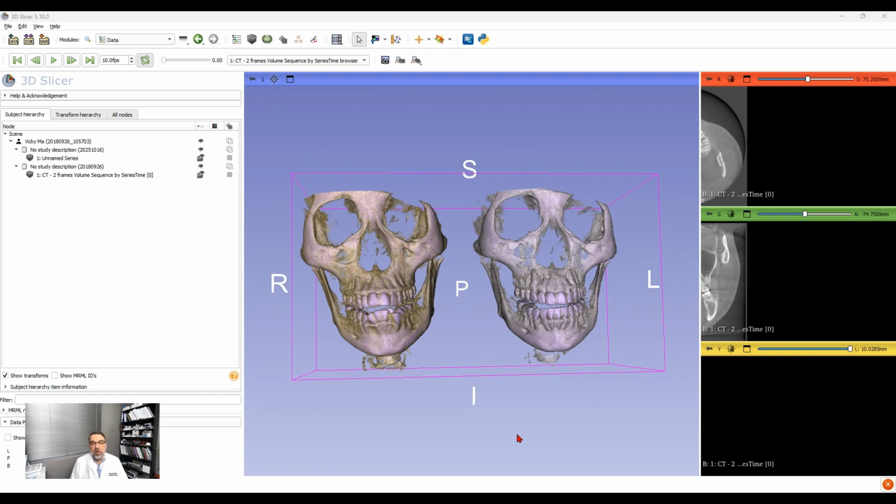So if you want to know, did my face mask really pull the maxilla forward, or how much the Herbst has grown the mandible, this would be a great tool that you will have fun with. And I want to let you know that you might need to watch this video 2 or 3 times to understand exactly how this works. Once you understand the concept, it's very easy, but there's a steep learning curve. So please bear with me.